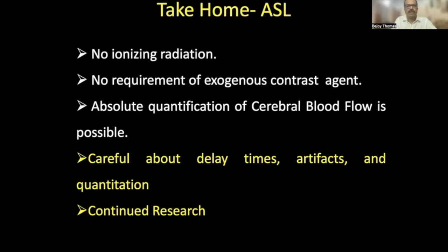To take home messages: ASL doesn't use ionizing radiation and doesn't use exogenous contrast, so it's a very useful and repeatable technique, especially in the pediatric population. In moyamoya disease it may be useful again, but multi-delay ASL may be more useful to estimate the CBF of the parenchyma adequately. ASL-based CVR measurements are also possible.